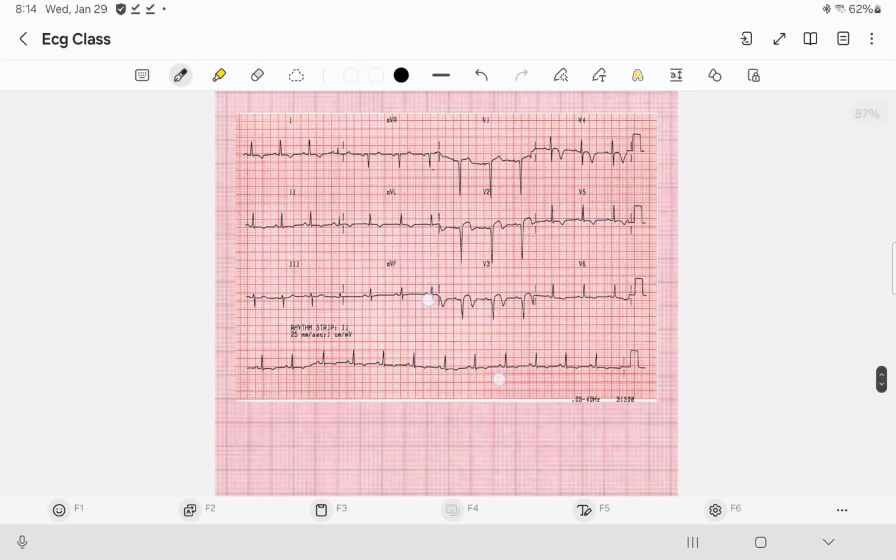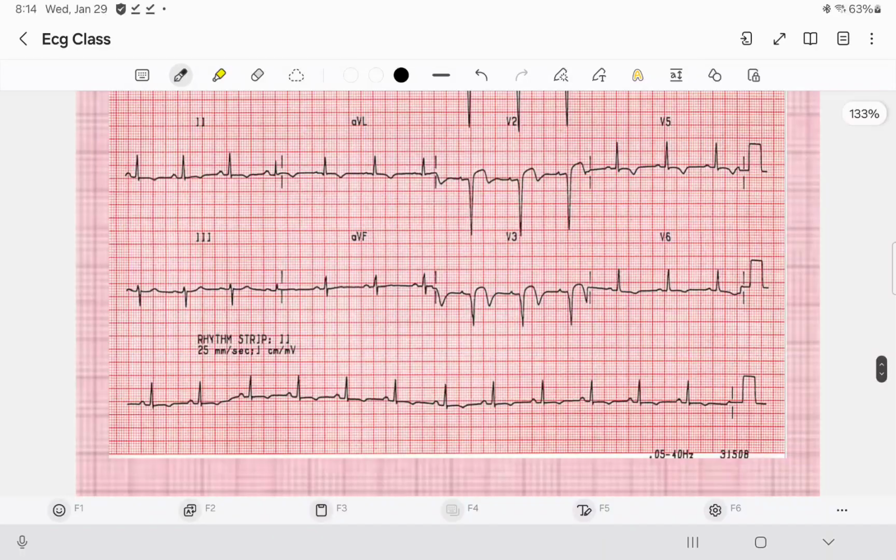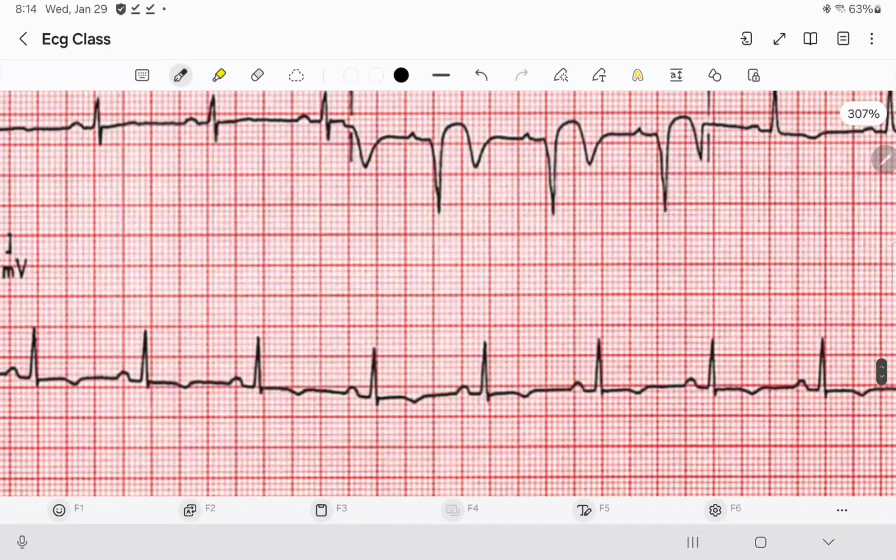Let's look at the last example. All right, this one is regular again, so let's use the small box technique this time. So you're going to count from here to here, about 6 plus 5, 11, plus 5, 16, right, plus about 4 more, 20.